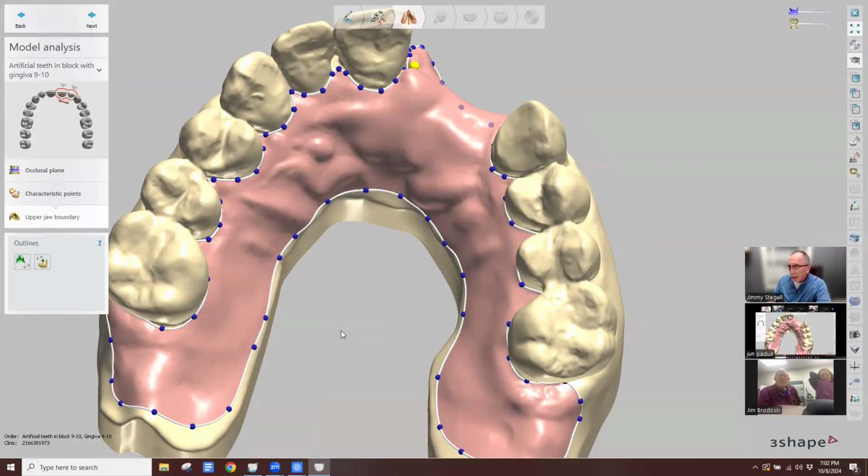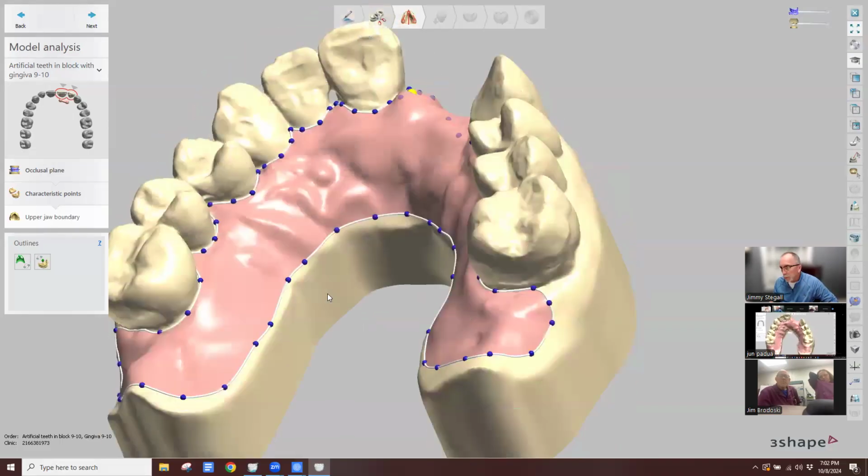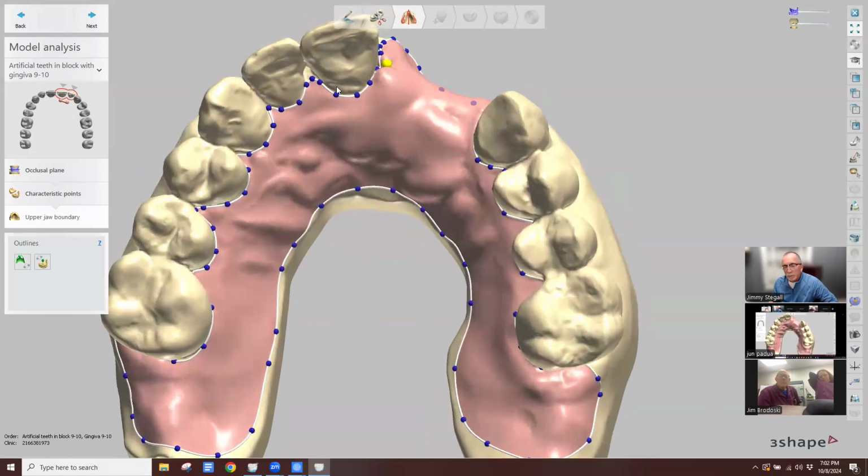And so I'm designing a base over a scan of the wires. It's going to create a little groove. I'll probably block it out a little bit more in the model phase just to make a little bit more room for pickup material. But then we would print the flipper and cure it, and then just do a cold cure repair step to get the wire bonded. Or I could use a tooth bonding material and light cure through the base because it's not going to be thick.